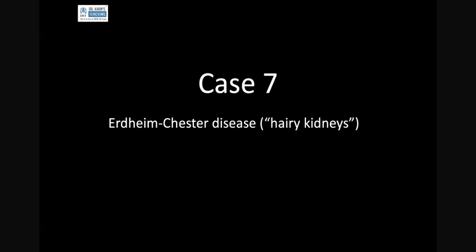Have you ever heard about this, candidate? Yes, sir. I have heard of the disease, sir, but not in the kidneys. Okay. Do you know that it is a pathognomonic sign? The word pathognomonic is a sort of an Aunt Minnie. This is it. End of story. And this is Erdheim-Chester disease, hairy kidneys.